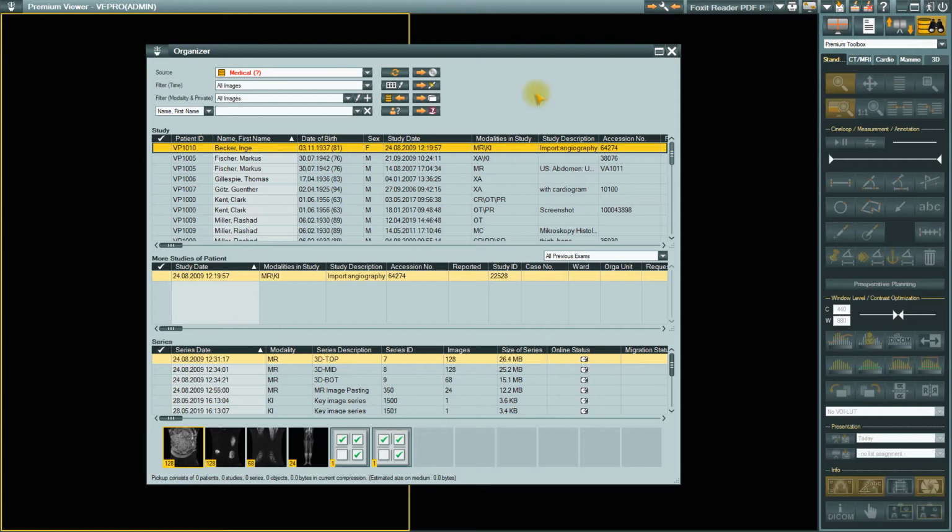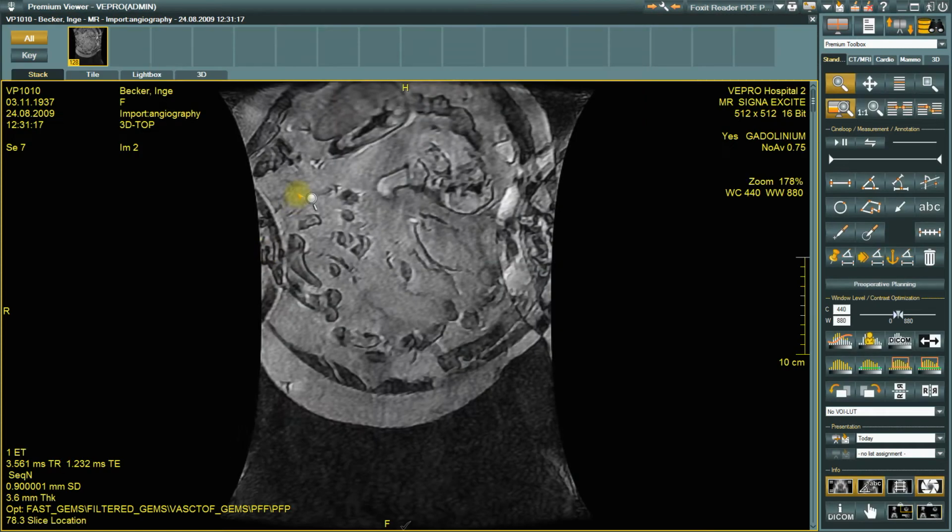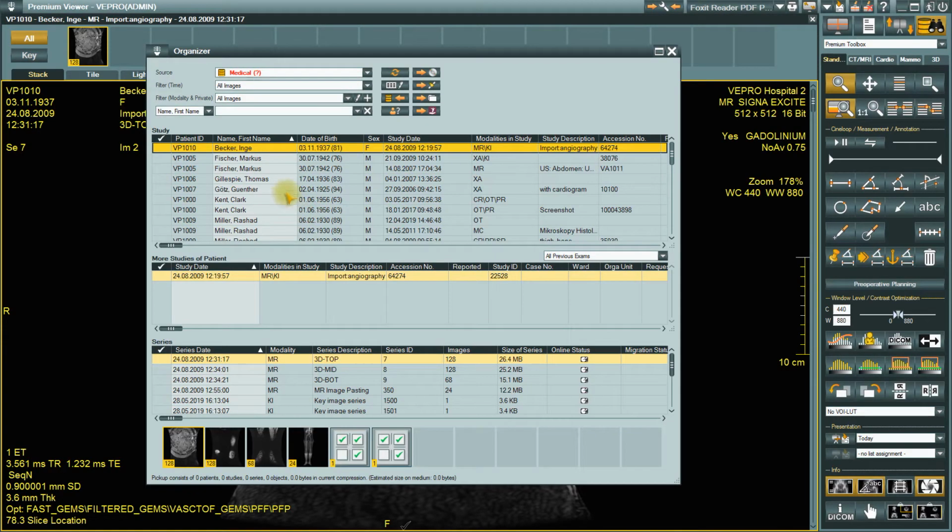screen in the way in which it is to be presented later. This naturally includes the display grid, the zoom factor, the window level and the comparison images, that is to say, everything that is of significance for the later presentation. The way the image is displayed now is exactly how it will be reproduced later in the presentation. Of course, all display data can be edited at any time using any of the EMR image editing functions.